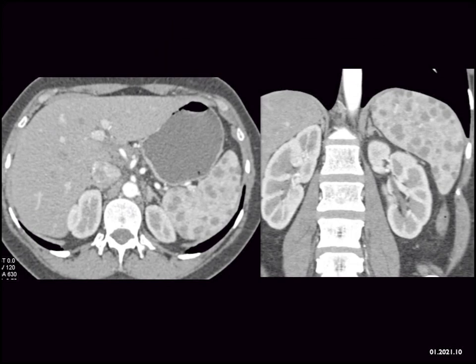And when you start looking, I'm only showing you the upper abdomen. So what is it that we see here? Well, this finding, maybe it's incidental or maybe it's important. There are multiple splenic lesions. Okay, that's very straightforward. I don't see any liver lesions. Well, if this was lymphoma, perhaps you might say, well, maybe it's lymphoma. Maybe the patient has something in the right lower quadrant. But this is an incidental part of the story. So what could it be?